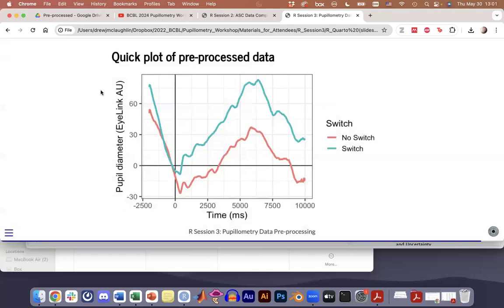Some people prefer what is called proportional baselining. And I'm going to refer you to the Geller paper to look into what the difference is. But what I want you to imagine is this y-axis, instead of going from 0 to 60, would be a percentage. It's a percentage change from whatever size it was here. That doesn't mean this will go up to 100. This just means it'll probably go up to like 15%. So your pupil has increased in size maybe about 15%.